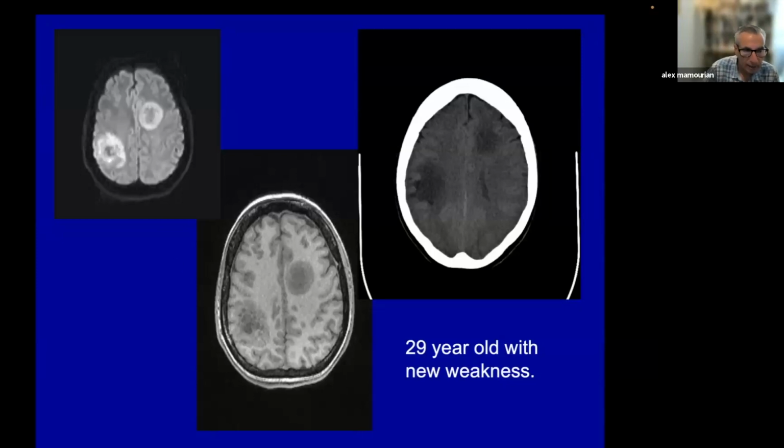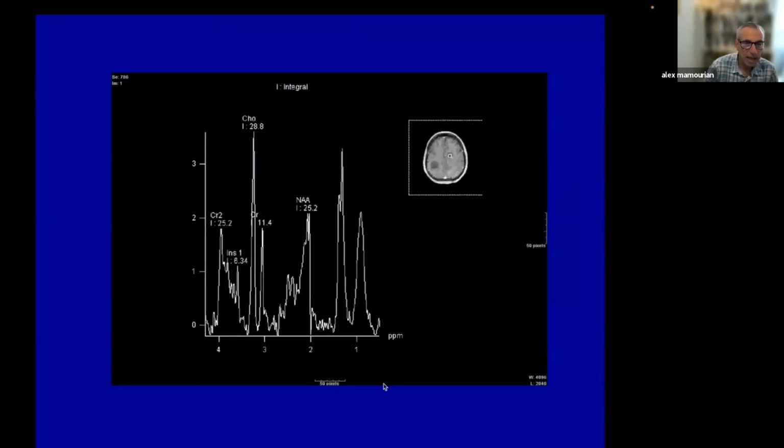And I think that this patient actually had an MR spectroscopy. And again, if you're familiar with spectroscopy, as we remember the numbering goes 1, 2, 3, 4 in terms of shift. Somewhere here is going to be your lactate peak. The NAA is diminished and the choline is elevated. So most people, I think, would look at that and say this is suggestive of a neoplasm.